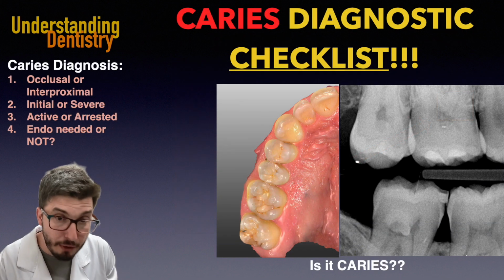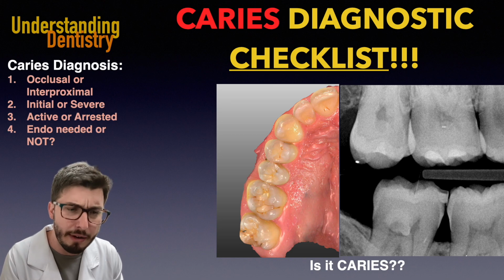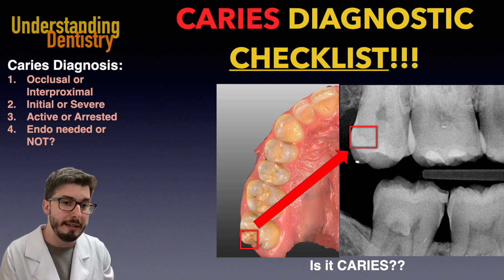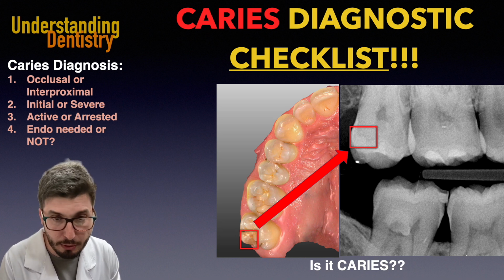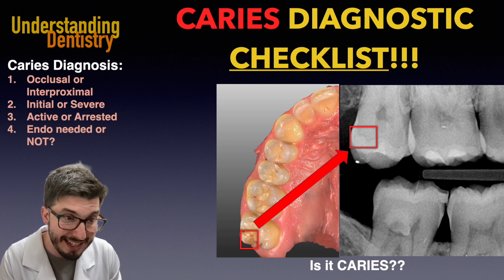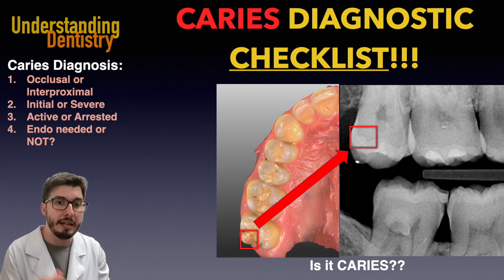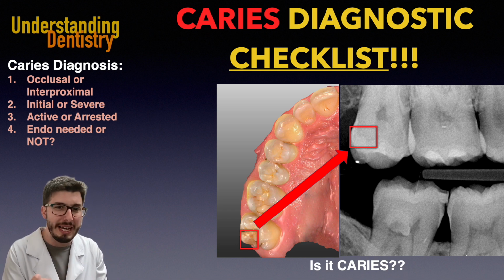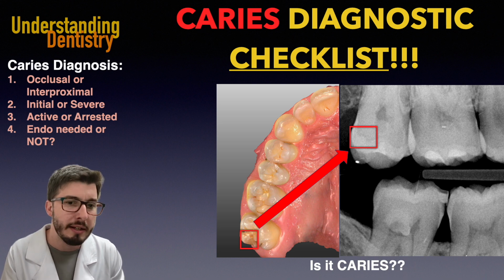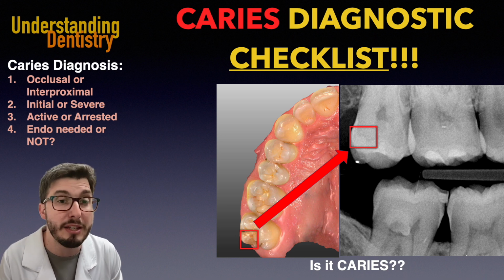So let's see the other side of this case now. And again, we have restorations, staining of the restorations. I don't believe, I will highlight in red as well, that the intraoral scanner scanned all this area of the second molar properly. But again, if there is no ball tip probe getting stuck in a cavity, then it's not caries, and this was still not caries, okay? Although we see a radiolucent aspect below the enamel, this is all around the molar, actually, if you follow the contours. So maybe this is the superimposition of another cusp or something else. Don't forget that these are 2D radiographs.